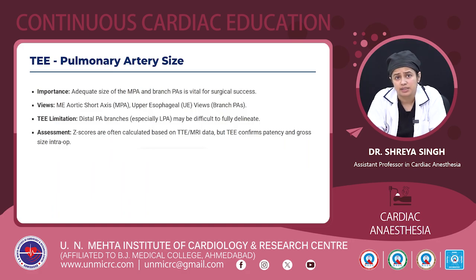Talking about pulmonary artery size, the importance is that adequate size of the MPA, the main pulmonary artery, and the branch pulmonary arteries is vital for surgical success. The views commonly used are the mid-esophageal aortic valve short axis view or the upper esophageal views for the branch PAs. The limitation in TEE is that distal PA branches, especially the left pulmonary artery, may be difficult to fully delineate, and Z-scores are often calculated based on transthoracic or MRI data. But TEE confirms the patency and gross size intraoperatively.